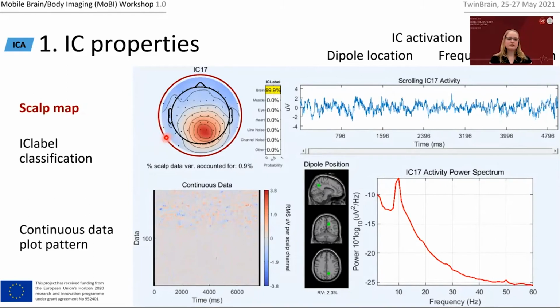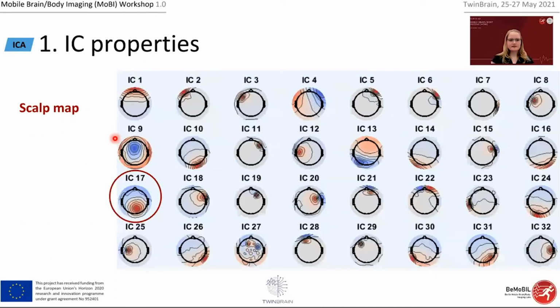And when we use the independent component analysis, we can basically go back and estimate the source localization by using a spatial filter of different weights for the electrodes, and then plot this distribution again as this nicely drawn figure.